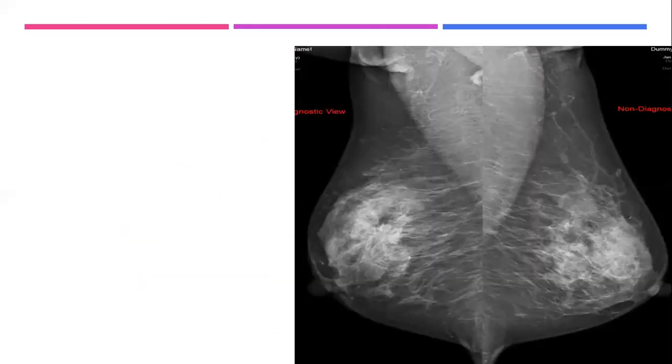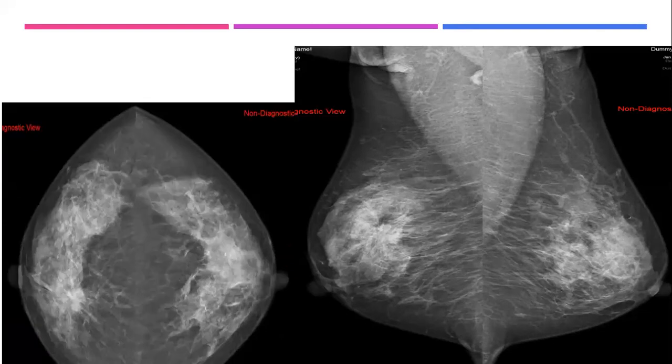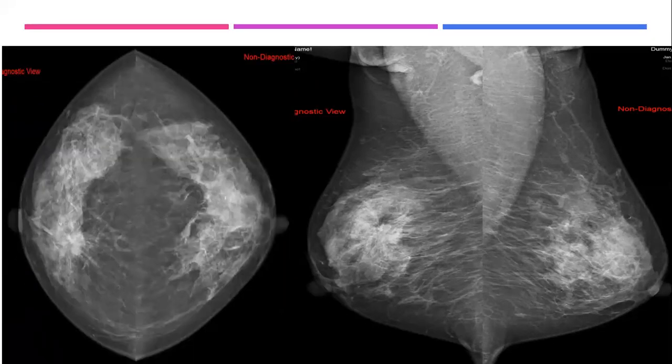God bless you. Okay, what about this patient? Any abnormality here? There is an area of architectural distortion associated with, I think, focal asymmetry or mass with a lucent area at the upper part of the right breast. Excellent. Well done, Suhair. So now on the craniocaudal view, it seems to be a mass with spiculation, a spiculated mass. Excellent. Give it BI-RADS 5.